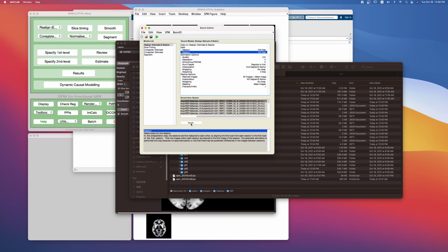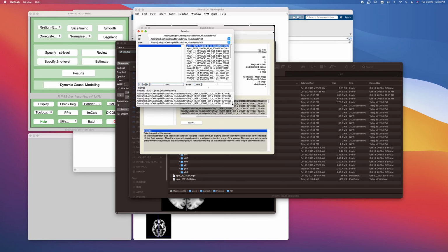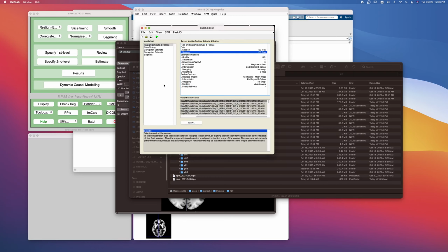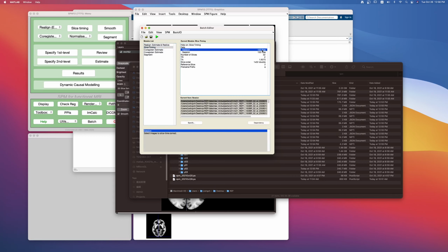And then I'm going to do the same thing, change the data that's being used for session 2. And I'm going to go to this subject's Rep 4. It's going to be series 33, and it's going to be 1 to 150. All right, so this is set. Then I'm not going to press play yet, because I want to complete everything, okay?